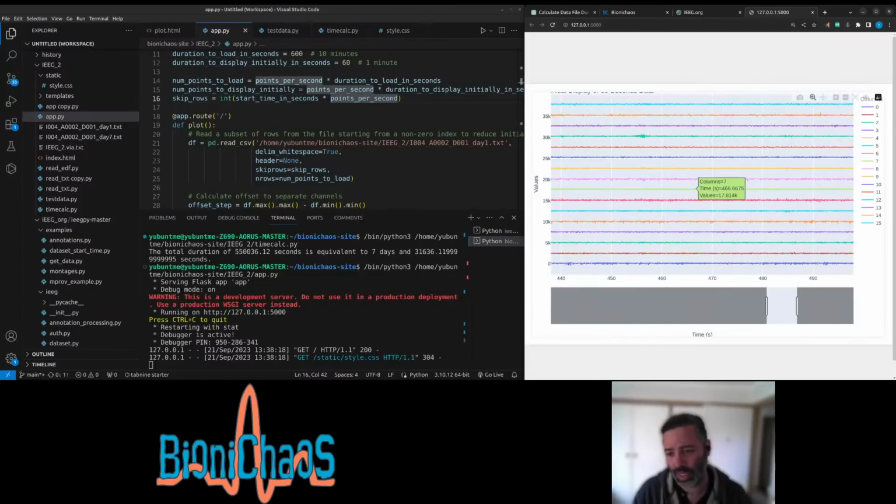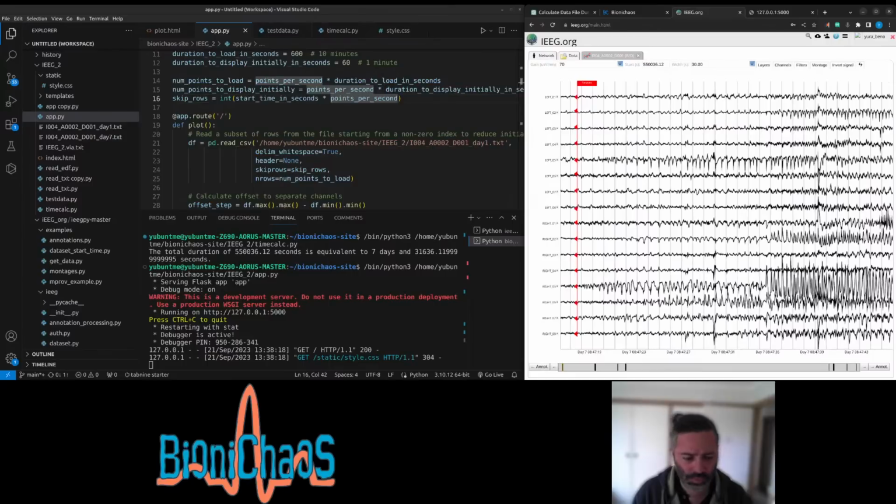There is a left and right intracranial EEG, 8 electrodes on the left, 8 electrodes on the right, like indicated here, but I couldn't find any documentation on it. The documentation they have here is pretty basic, doesn't have any details. There should be some sort of metadata somewhere, but I couldn't actually find it. I'll have another look later.